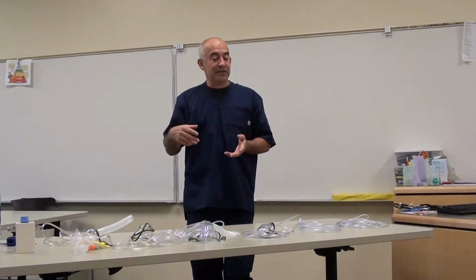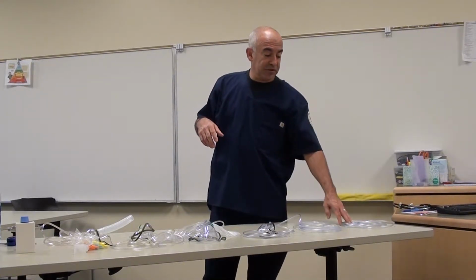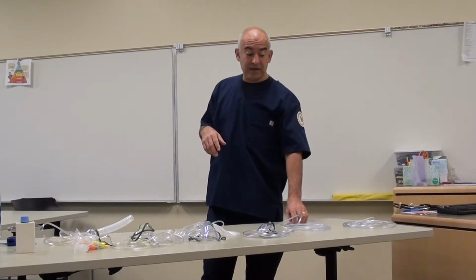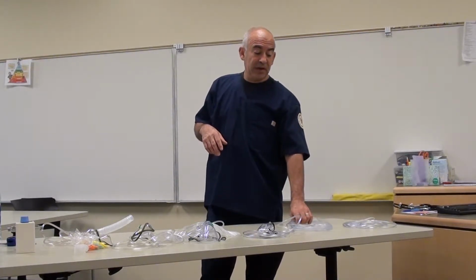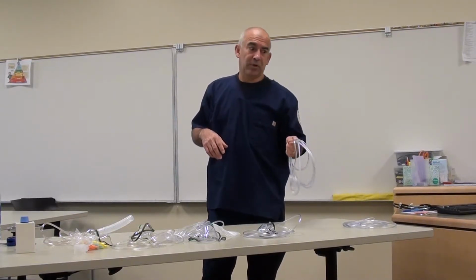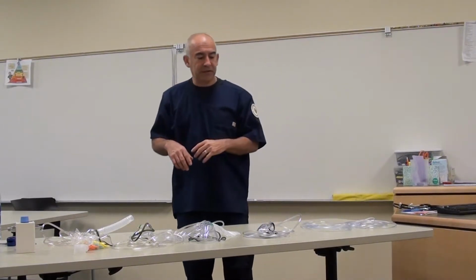A disadvantage of this particular device, also similar to the nasal cannula, is that it can cause nasal dryness, soreness, and nosebleeds. Another disadvantage is that it does have to be replaced often, more often than you would with a regular nasal cannula.